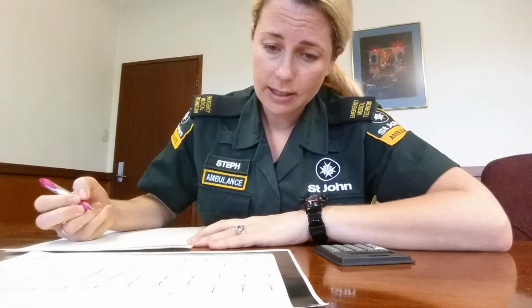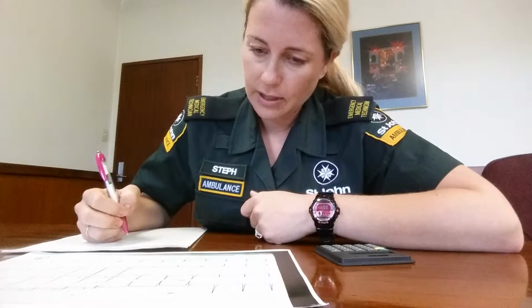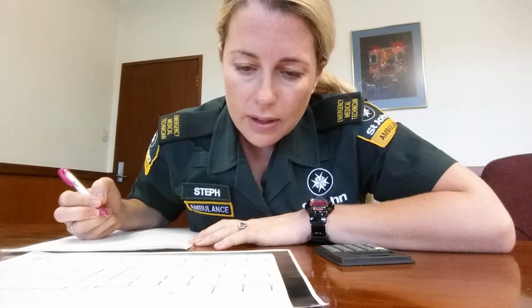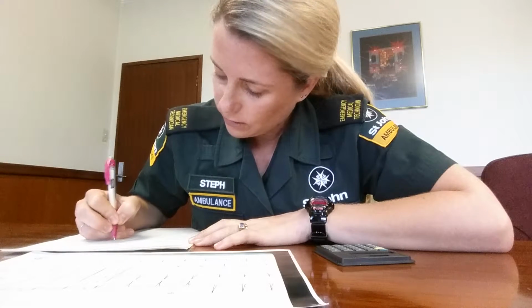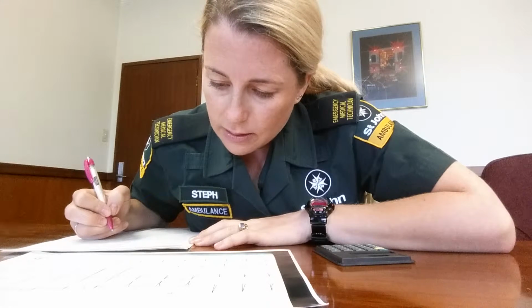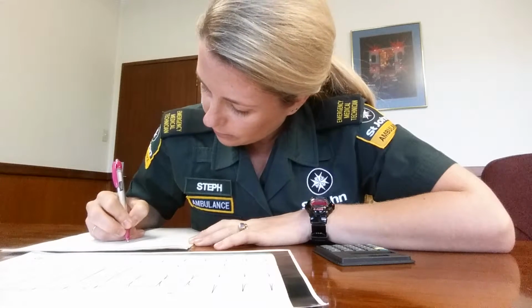And then we'll go for axis. So using the thumb method in 1 and AVF. AVF is negative, so it looks like it could be left axis deviation, but I'll just quickly graph it out to make sure. We've got 5, 10, 15, looks like 20 positive across to the right, and in AVF, we've got 1 minus 5, so -4, so we go down 4.